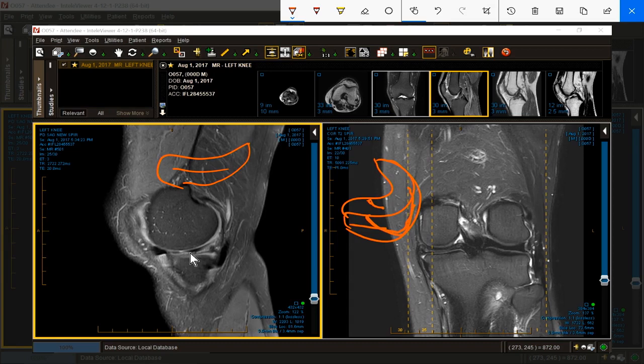It's dove this way. Is that a word? Dove? Let's try dove. So it's doven forward. It's doven backward. You can also doven in temple by doing this. And it has bounced down off the bottom and come back off the top. So it's got complexity to it.